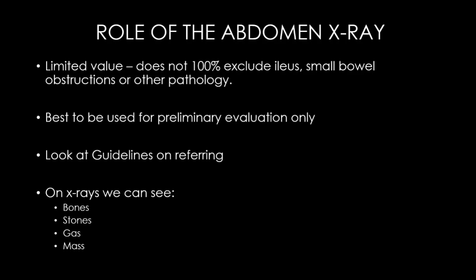So it's important to just look, if you do have the base of the lungs included on the x-ray, just have a look for things like effusions. You should do ultrasound initially, really, to look for gallstones, and then CT around 72 hours later to look for more severe complications such as necrosis.